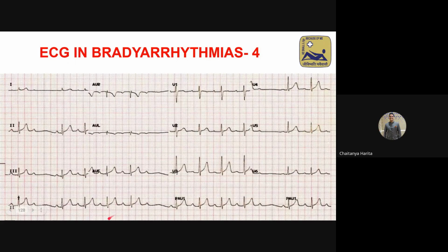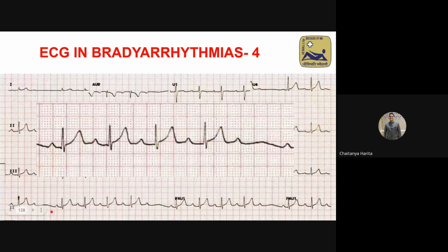But you look at ECG number 4, again, calibration normal, axis okay, no dramatic STT changes. But if you look at lead 2, which is your rhythm strip on the bottom, you will see some findings. I have zoomed it. I've taken a strip of lead 2, and this is what you see. This is the PR interval. This is approximately 1, 2, 3, about 5 boxes. PR interval, 6 boxes. PR interval, 7 boxes. PR interval, 7 boxes. PR interval between P to P. This is not PR interval. There is no R wave here.